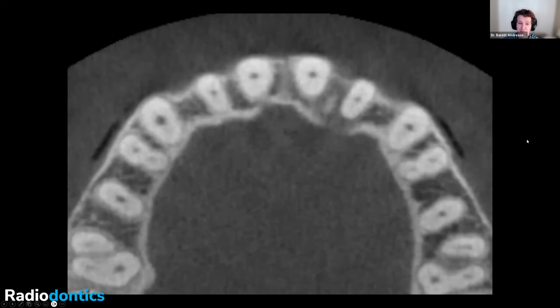Okay, here is our first quiz of the night. So I want you to apply what we've just been talking about to review this single screenshot of an anterior maxilla. So we want to be looking at the cortices, want to look for any significant changes. I tried to pick a little bit more subtle case so that you don't have an obvious radiolucency or radiopacity just jump out to you. But if we follow along the cortices, we want to look for any changes here, any obvious changes.